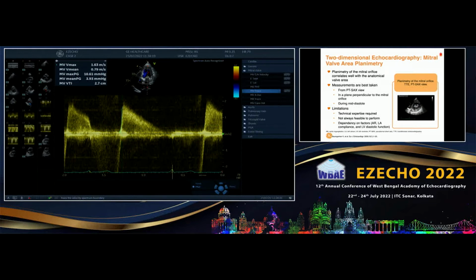So, most of the RBCs are moving in this velocity spectrum. So always take the outer border of it. Don't take these spikes, which are the feathering artifact. So the outer border of the modal velocity is what you are going to take.